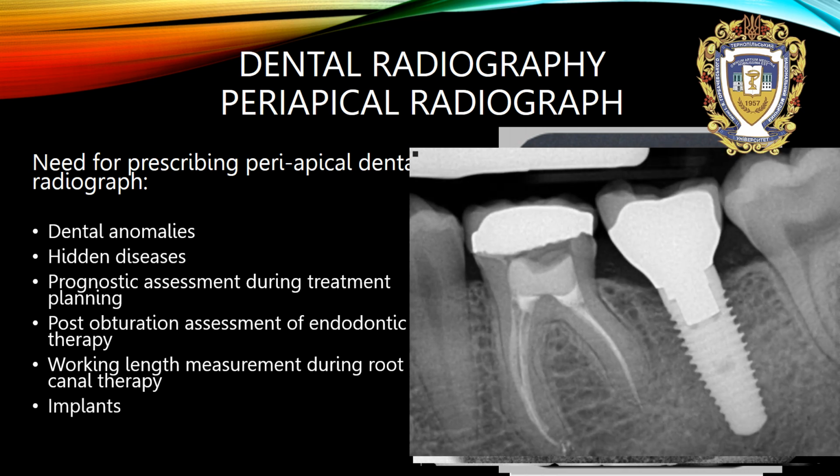And of course, in the case of implants, we need to evaluate the peri-implant bone, and we need to evaluate the bone in the area of the neck of the implant, to be sure that there is no inflammation or some cement from the implant.